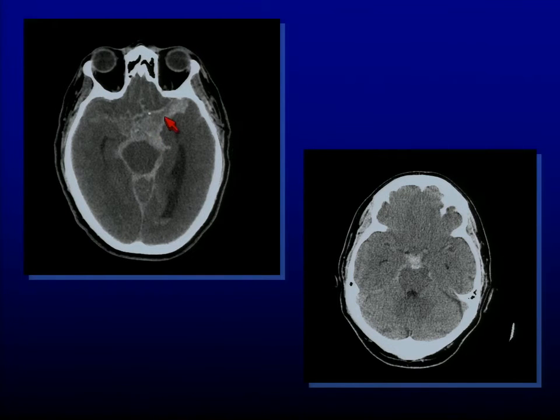What is it? Well, I remember that's where that suprasellar cistern is, and I know that's where the circle of Willis lives, and I know it's supposed to be black and full of water, and instead it's white. It's refluxing out here into the Sylvian cistern, refluxing out here. It's refluxing into that circummesencephalic cistern. It's everywhere. So this is hopefully one that no one would ever miss.